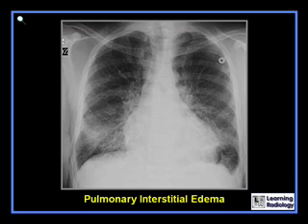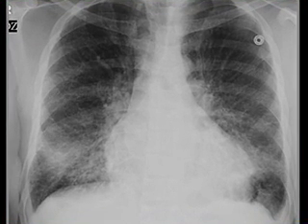This is an overview of a patient with pulmonary interstitial edema. As we look at a close-up view, we can see that there are Kerley lines, there is a laminar effusion, and we'll get to some of these findings in a moment.